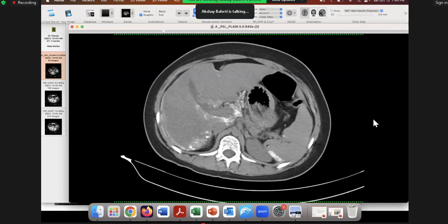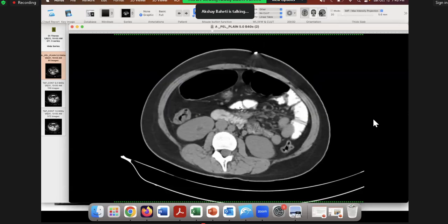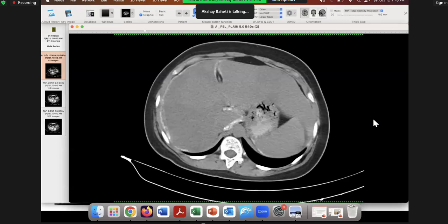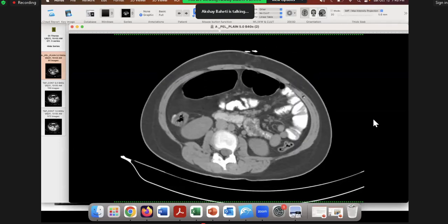So when you see such diffuse calcification, I'm not saying that high grade cannot have some calcification. It can still have some focal areas of punctate calcification, but not something so diffuse. If you see something so diffuse, sometimes it can be completely white also. Then it's always low grade serous ovarian cancer, which is a very distinct subset, because it is not that aggressive.